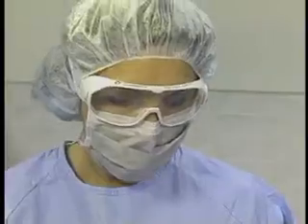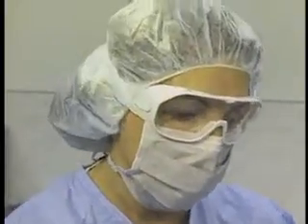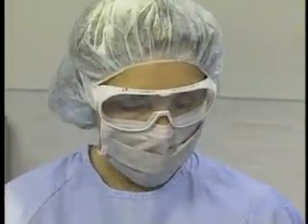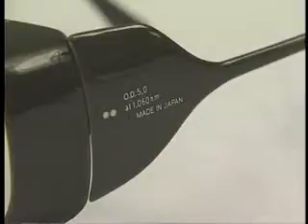Clean and inspect the eyewear routinely. Do not clean the absorbing or reflecting surface with chemicals or abrasive cleaners, as this will damage the lens. Look for pitting, cracking, and scratches, and inspect for light leakage that could permit intra-beam viewing.